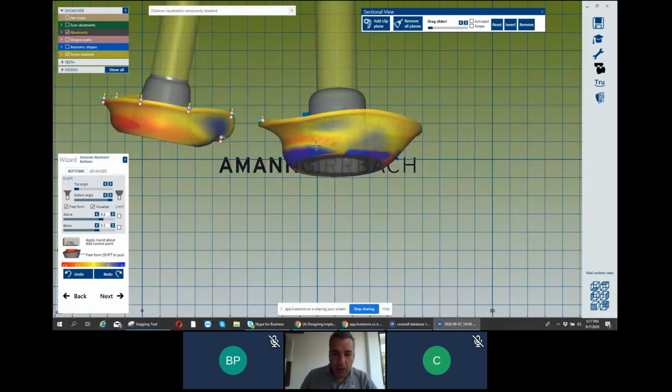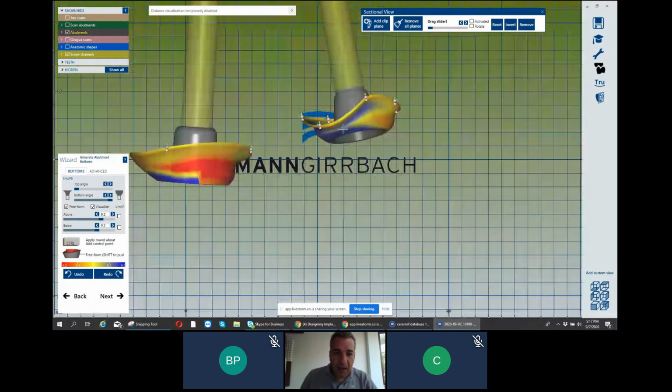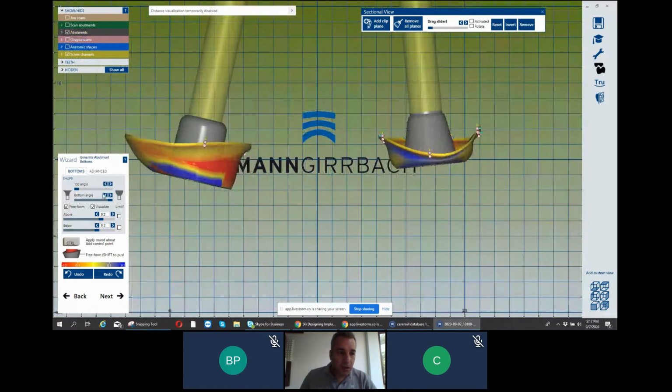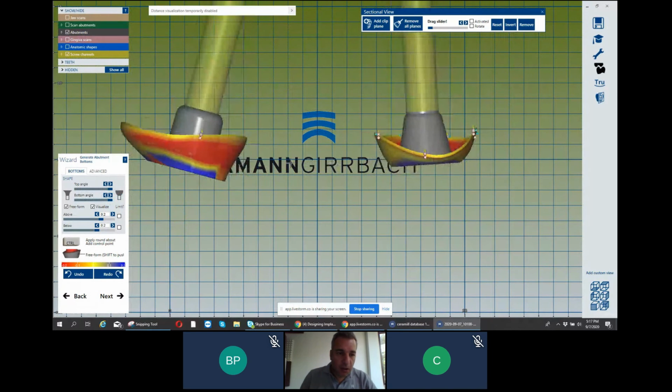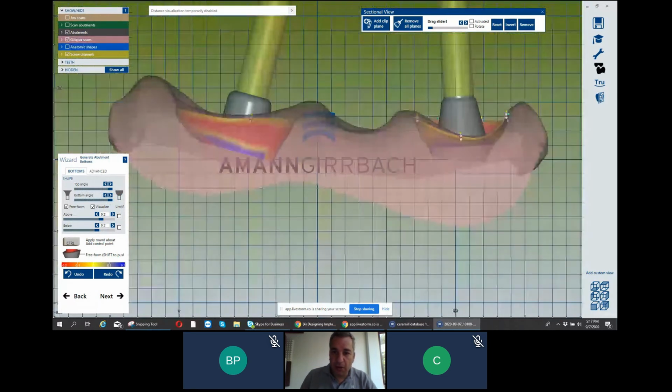You keep on playing the whole night and whole days. You will not get the shape of it. So the easiest way, randomly, it has to be bigger. You see here, it's big. Also, I will show you with sectional view.